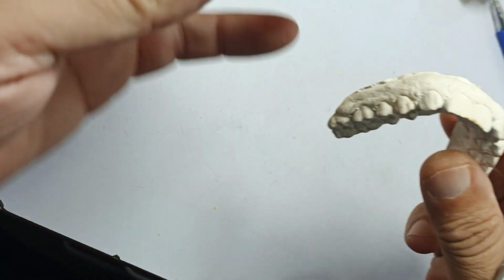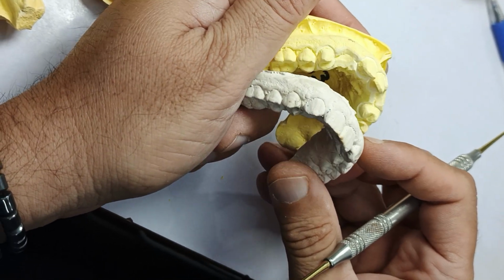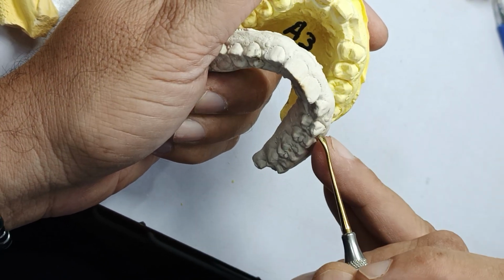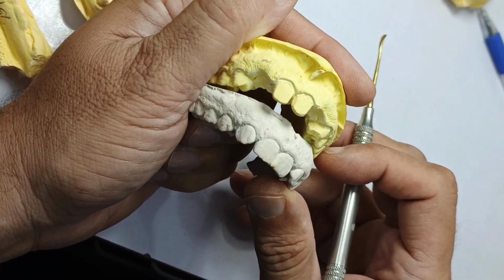Oh, this is the before and after. Astaghfirullah. Look, you know what happened? See that? It's incredible. They extracted the canines, both canines, and they are making a bridge. Central incisor didn't need anything done. And then they say patient doesn't want ortho. You reject the wrong treatment.